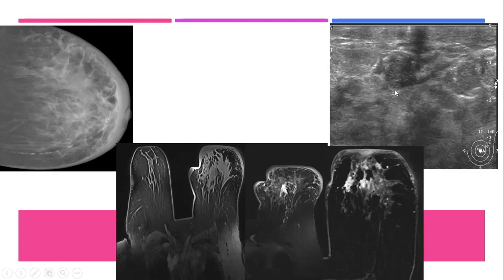Okay. So in MRI without contrast and post-contrast, on the left side there is an extensive hyperintense mass. This is pre-contrast and this is post-contrast. It is iso-intense in pre-contrast.